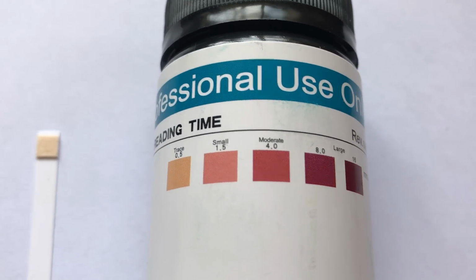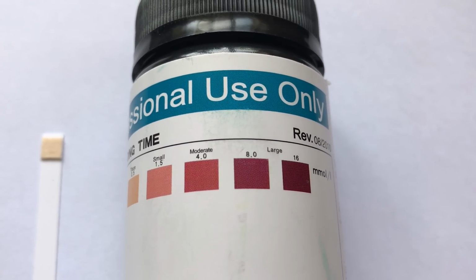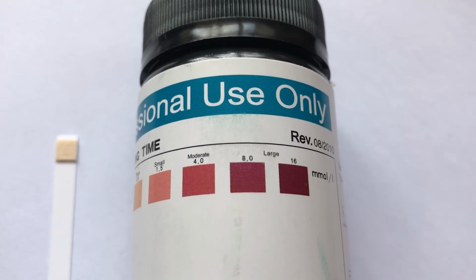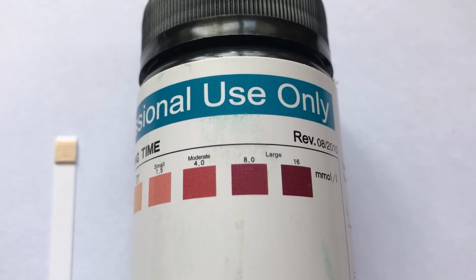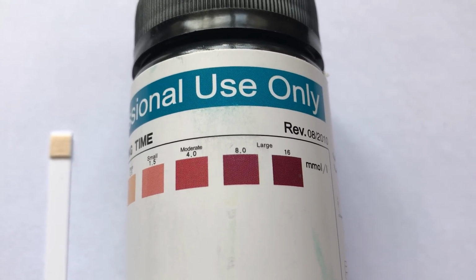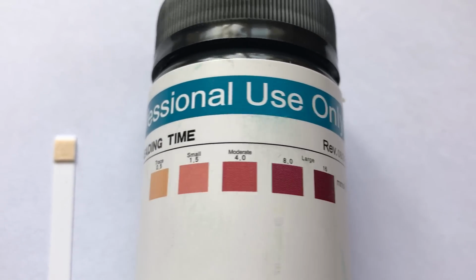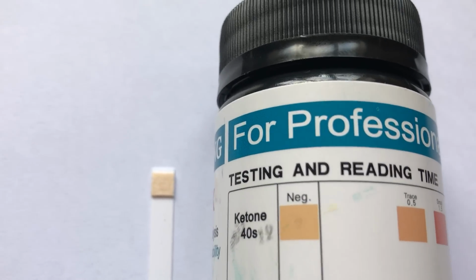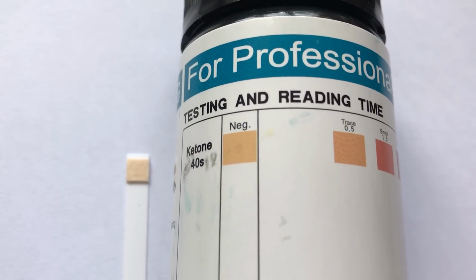Now, you've got to remember these guidance and ranges are put there really for when these test strips are used for the detection of ketoacidosis in diabetics having a diabetic crisis. The significance of these levels is more for those clinical uses, and there are no packs that have been modified or labelled specifically for guidance for dieters. So you have to interpret the significance of the ketone levels in relationship to these results.